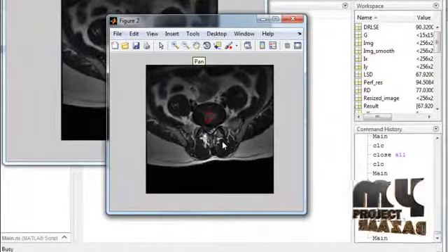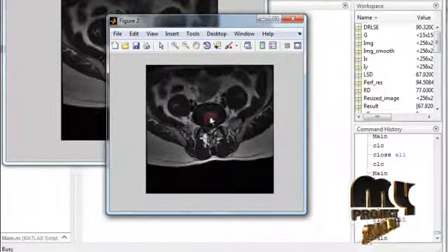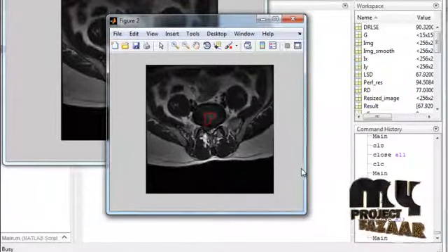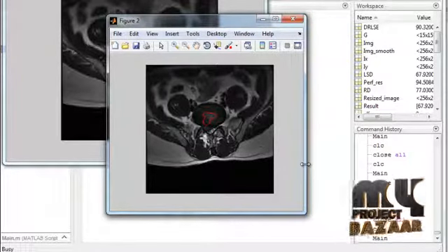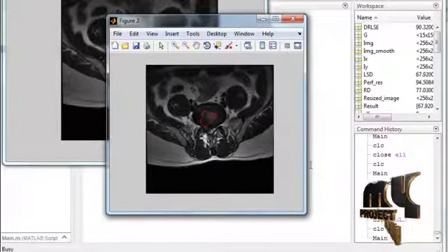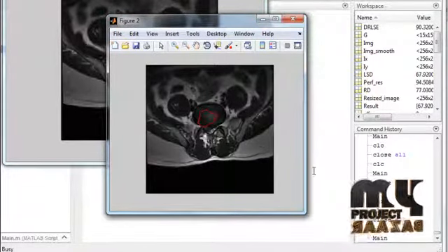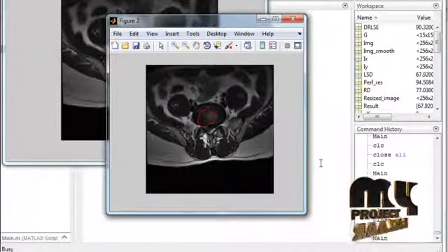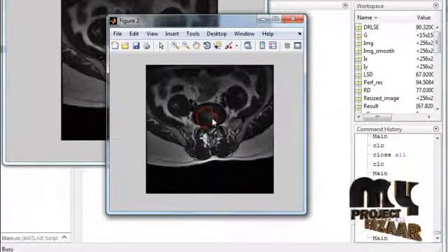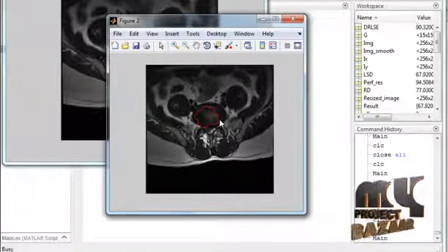And this is the final contour image, which detects the boundaries, and the red curve shows the final contour. Using the edge information, the nearest neighboring pixels are calculated, and it finds the boundaries of the regions of interest.